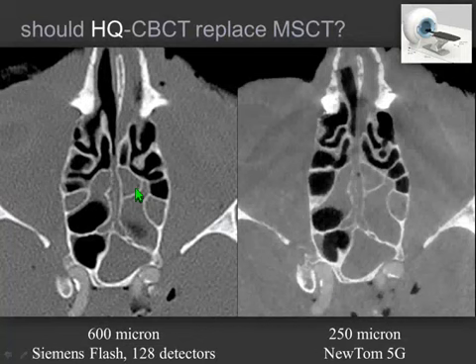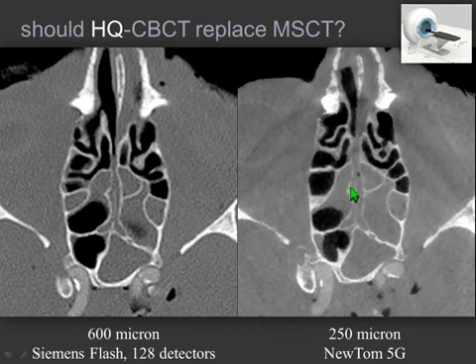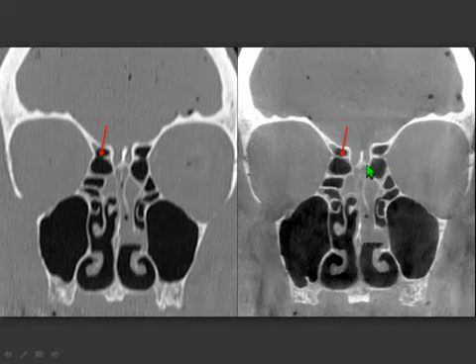This is a comparison between CT and the high-resolution cone beam CT. The patient in this solution is lying supine, therefore the chance of movement is less relevant than in a sitting position, but the acquisition time is greater than the time required for CT. A few seconds for CT, at least 30 seconds for the high-resolution technique, though the exposure time is something like 2 or 3 seconds.